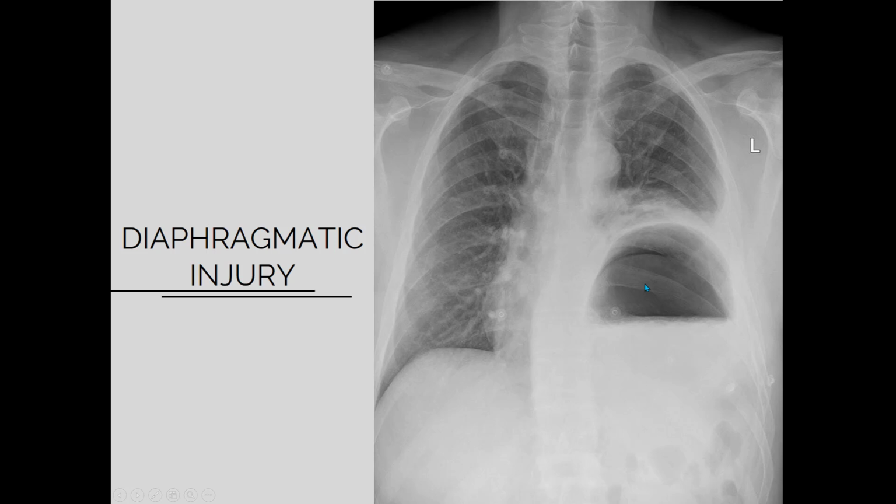And which type of X-ray is this? This is basically AP erect. Why erect? Because you can see the air fluid level here.